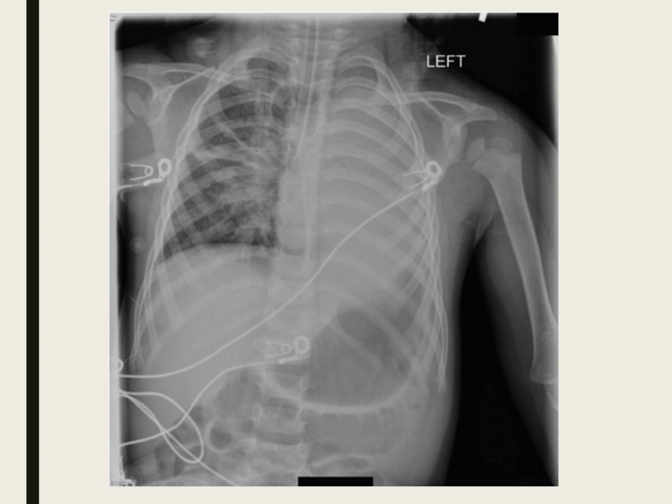So we're gonna follow our ABCDs. A, airway. Where's the airway? Is there anything in there? There's an endotracheal tube, airway looks relatively midline. B, bones, they look kind of small. I think this is a younger person, just from the appearance of the X-ray.